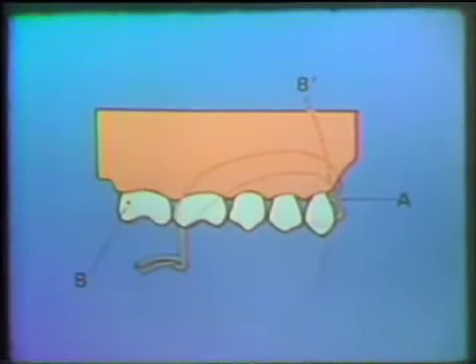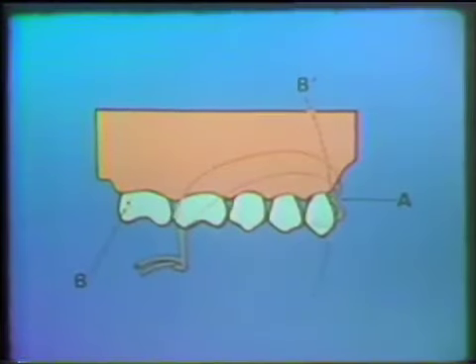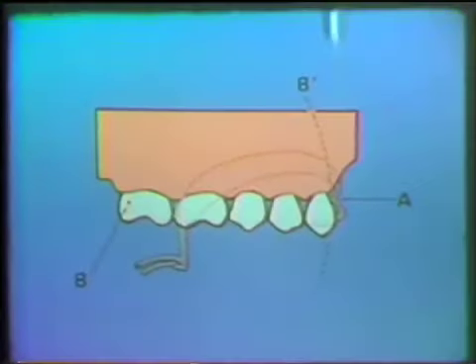The mechanics of the Class 4 rotational path can be illustrated in this series of diagrams. The anterior segment of the framework is seated first by placing the rigid minor connectors at the depth of the proximal undercuts. Point A then becomes the approximate center of rotation as the framework is rotated into its final position.